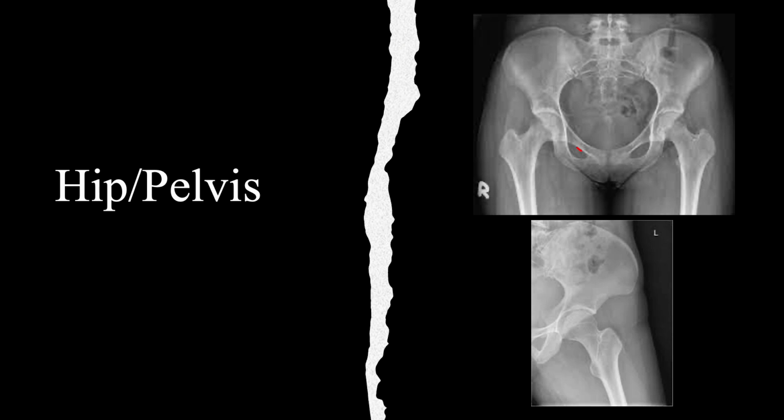Then go to the obturators, same thing, looking for any fractures, dislocations, or disruptions that could be around there. Make sure that they're smooth and symmetric. Then you want to make sure that the arcuate lines are unbroken and symmetrical. So the arcuate lines are back here.